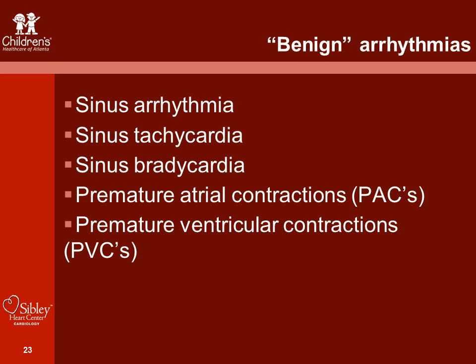Talking about some benign arrhythmias now. Sinus arrhythmia is a variation in the heart rate that is seen with respiration. During inspiration, our heart rate increases, and with expiration, our heart rate decreases. And this is a normal variant. It's a sign of a healthy heart.